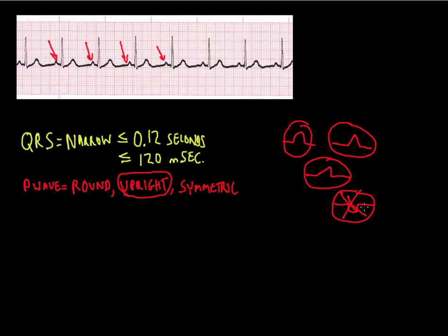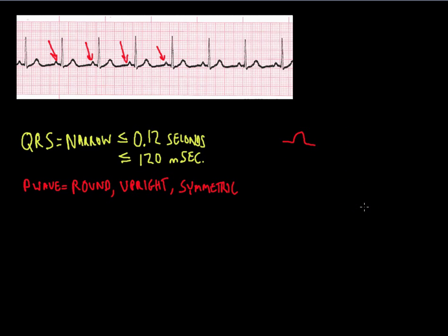Well, what does that mean? You're going to have to come back in a few weeks and we're going to go through what these different abnormalities are. Like I said, I'm giving you guidelines on what is a normal rhythm here in this case. So when anything deviates from normal, we just have to come up with a slightly different variation on the name for it. So let me clear away some of the clutter here.